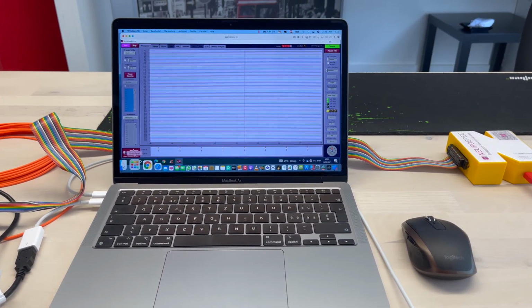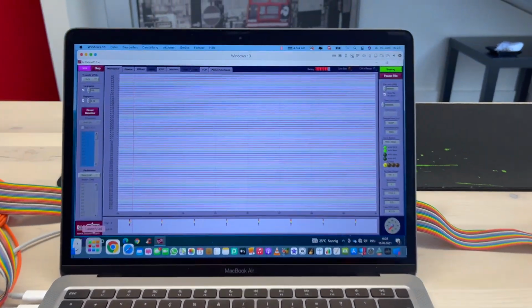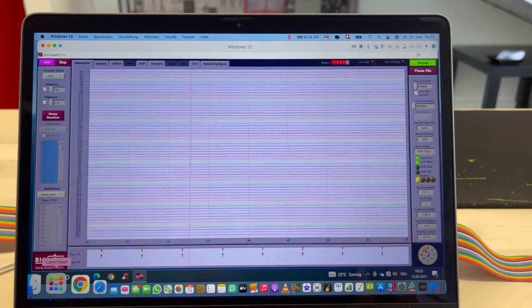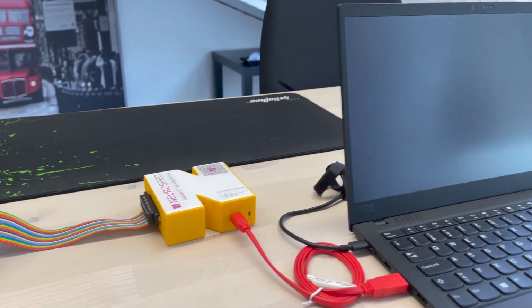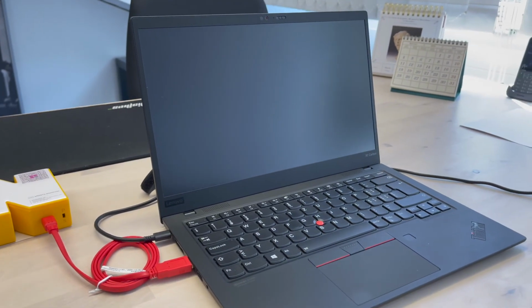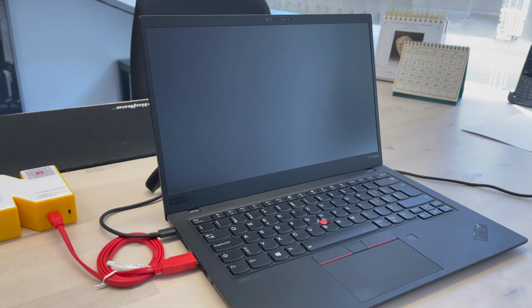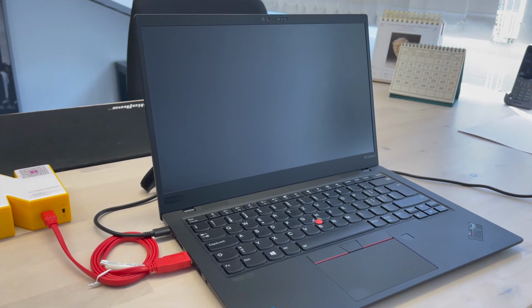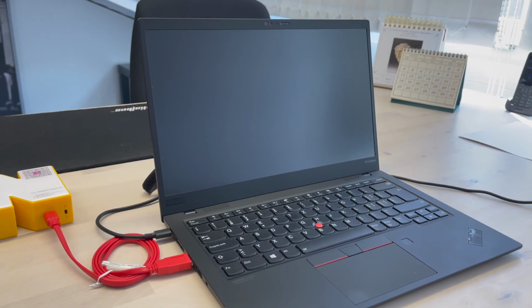We're getting triggers. It's an 8-bit trigger down the bottom. Information coming via the beautiful MMB trigger box and the Lenovo, which is currently having a black screen. That's because it's sending triggers. It's just sending 5 volts down 8 lines.